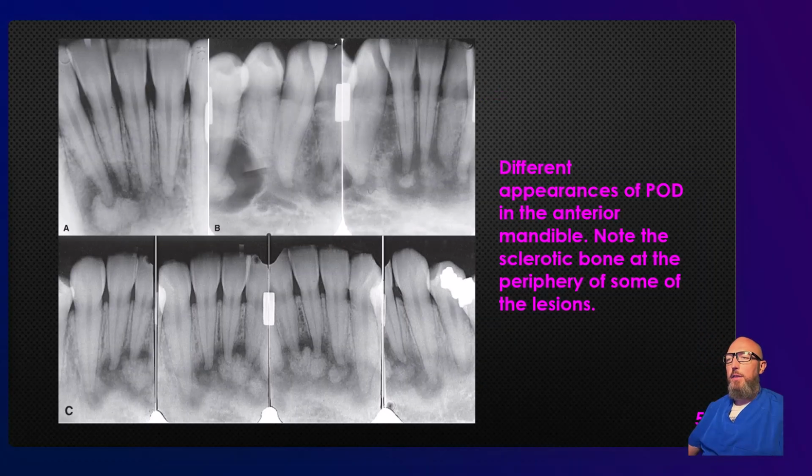All right, and these are just other variations of it, maybe a wider radiolucent component. Sometimes these are associated with simple bone cysts, which we'll cover later, especially the Florid type. But sometimes that cystic component of it can be larger than others. It's still just periapical Cemento-osseous dysplasia. You can just see the variation here.